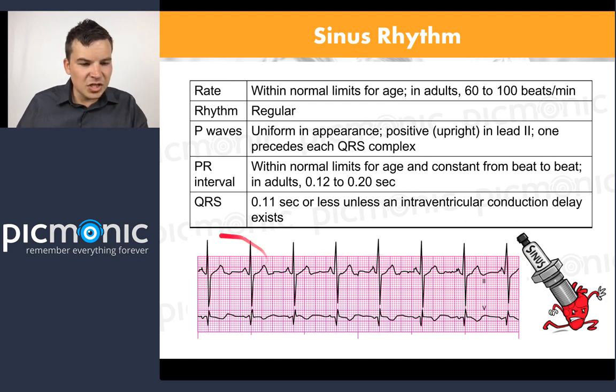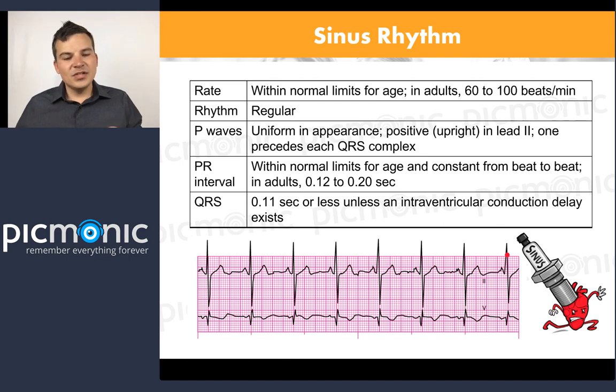I should make like a cheat sheet for myself. 1, 2, 3, 4, 5, 6, 7, 8. So it's about 8. Actually, this is the same rhythm I just showed you a minute ago. So I just realized that. So the rate is about 80, right?